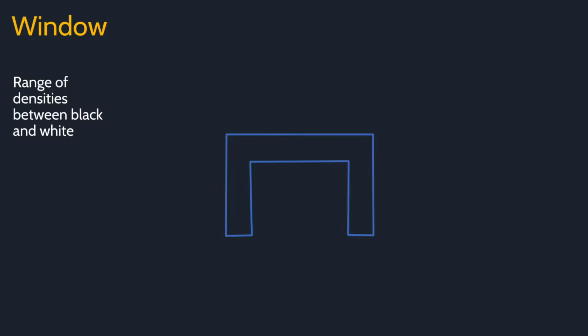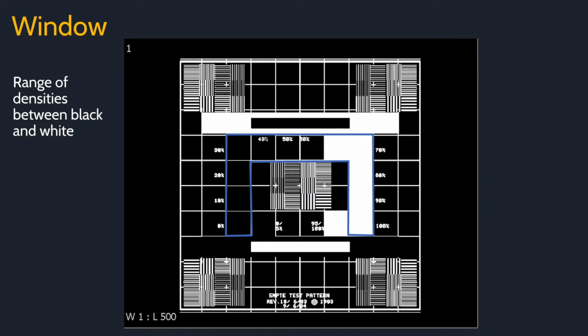During this image, focus on what is within the blue outline. This is a test pattern of different densities, with 0 being hypodense and 100% being hyperdense. The window and level are displayed on the bottom. As a side note, the two 50% boxes are in fact the same densities despite sometimes looking different. This is an illusion.